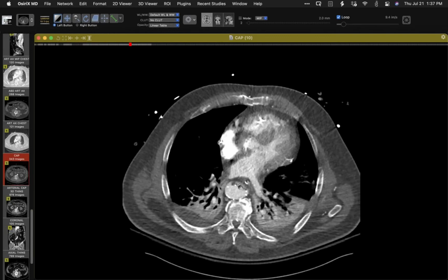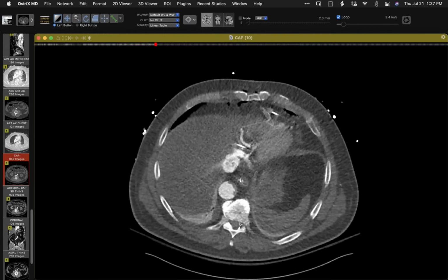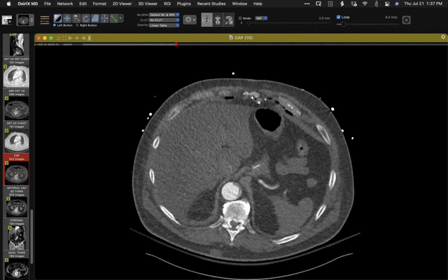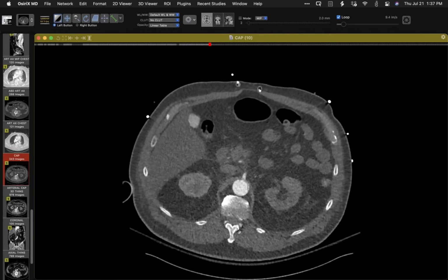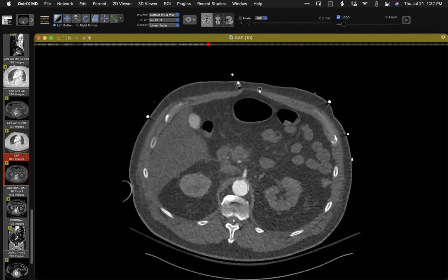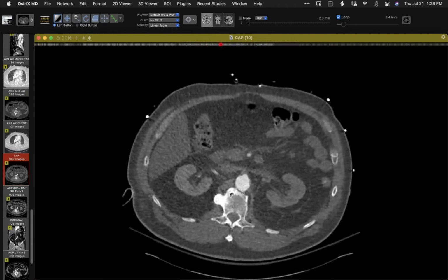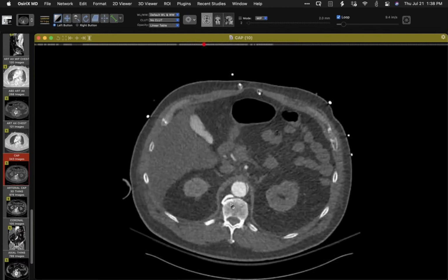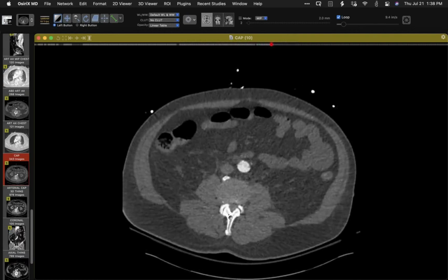Therefore, what comes off anteriorly and is being substantially compressed is the true lumen, from which visceral vessels are arising. But now that false lumen has most of the blood flow. The true lumen is compressed, and the amount of perfusion through these visceral vessels, and there turns out to be a replaced right hepatic artery, is very substantially diminished with substantial ischemia involving the bowel and other organs, even the liver, because of a replaced right hepatic artery. So I've not seen this complication before, but there you go.